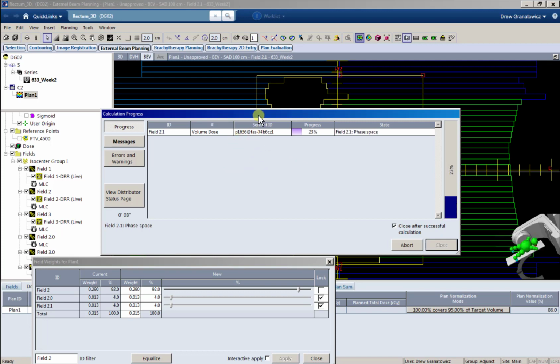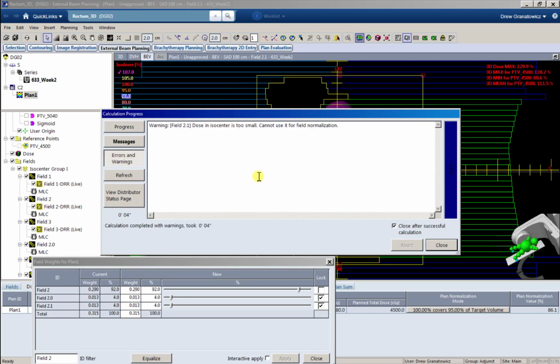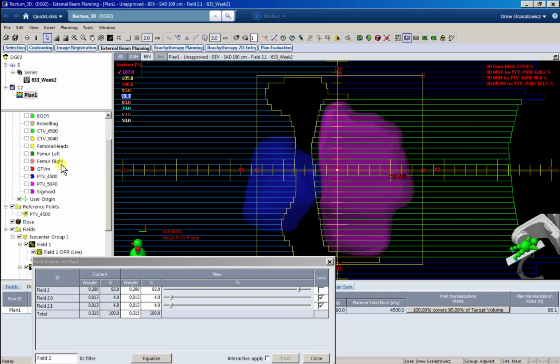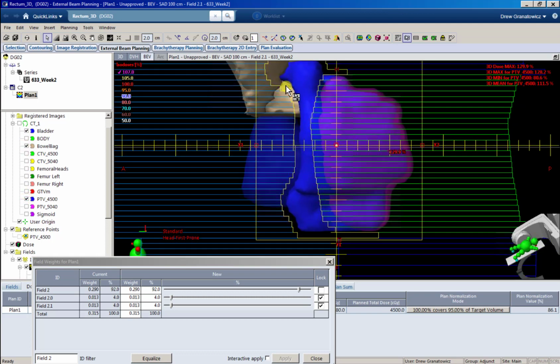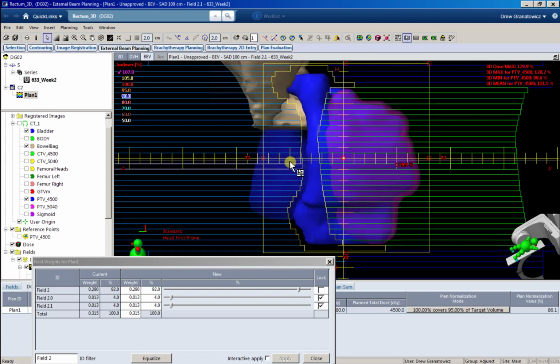So you can kind of adjust that small bowel and bladder dose with your field weighting, but again, like I said, really it's going to come down to your block. So right now we have that half cm margin. So if we're unhappy with our bladder and bowel dose, if we need to really lower that dose, you're probably going to adjust your block, and usually you're going to have a discussion with the doctor and adjust that with the doctor if you're going anything out of the norm.